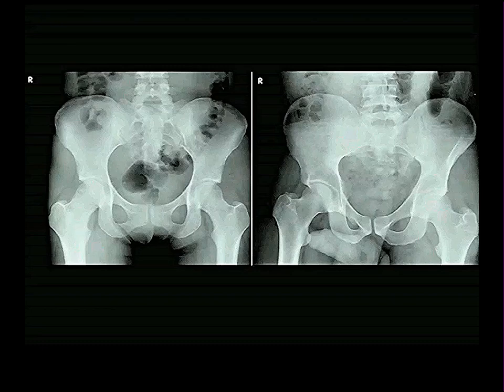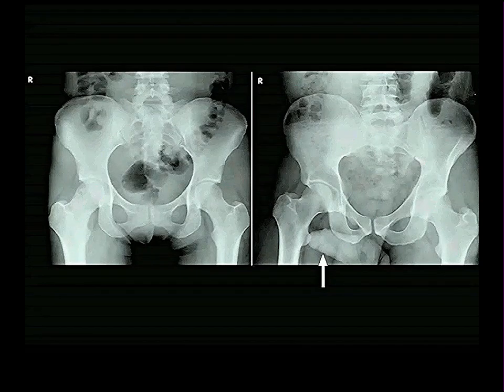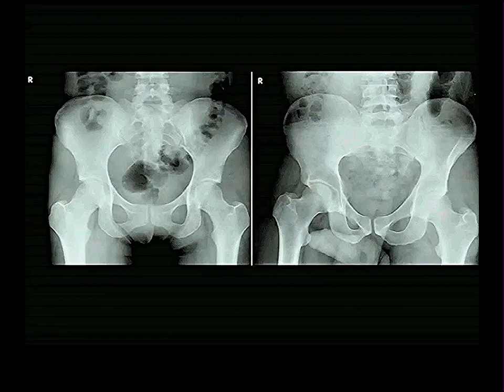Time's up. All right. That's not why. Why do you think it is? You're absolutely right. Here's another clue. This one has a penis. No one ever sees the penis. They're always focused on the bones. All right? But you're right. There is a difference.